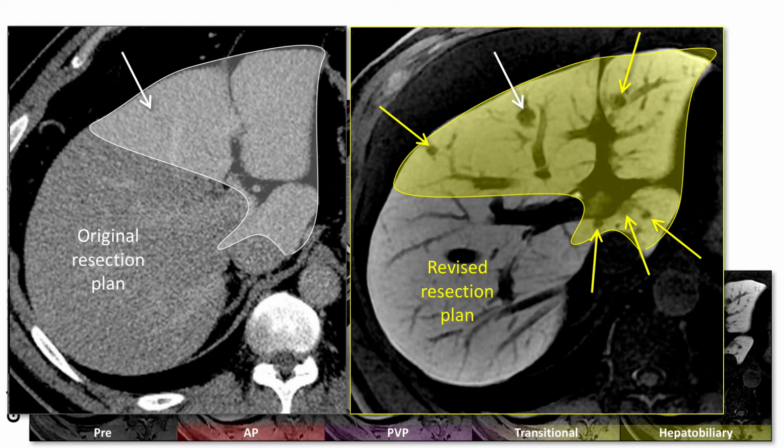Now, hemangiomas still follow the blood pool when you give gadoxetate, but now the blood pool goes dark. And so then it just becomes more confusing because now you see a lesion that was bright in the arterial phase, isointense in the transitional phase, and dark on the hepatobiliary phase. Is it impossible to make the diagnosis of hemangioma with gadoxetate?